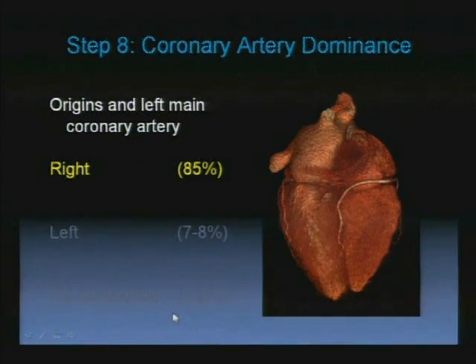Smita mentioned coronary artery dominance, and this is what I'll do. I'll look at the coronary artery origins, make sure there's no anomalous coronary artery. I'll quickly look at the left main, okay? Because it'd be crazy if I spent 20 minutes struggling on whether the PDA has a 20% or 30% stenosis, and I miss the 70% stenosis of the left main, so it doesn't make sense.